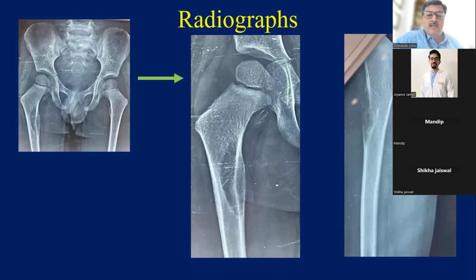So what possibilities would you think based on this X-ray? It looks like not a completely non-aggressive lesion, because it is causing significant thinning of the cortex and some minimal periosteal reaction, but we probably need to do an MR for the lesion. Yes, that's right. But what would you suggest to the fellows when you see such a lesion? One thing is it certainly needs further imaging to come to a conclusion. What things can they think about?